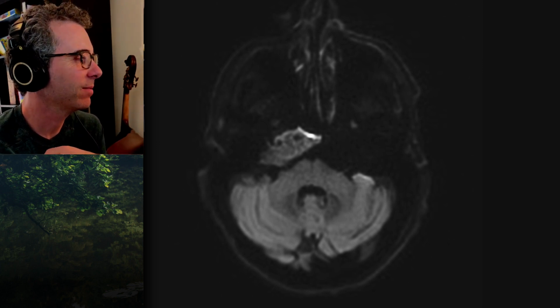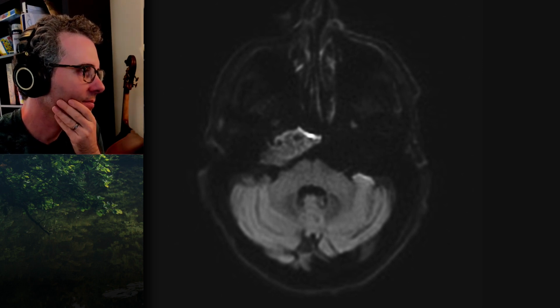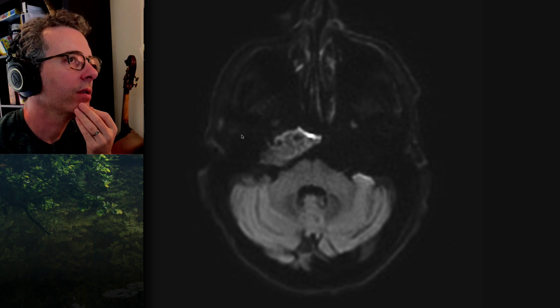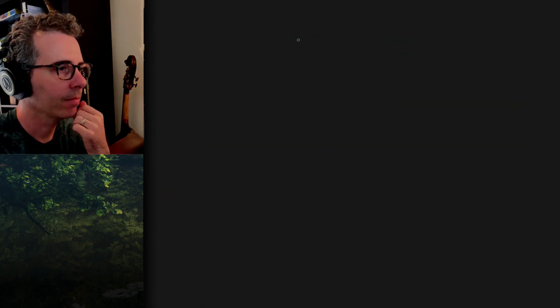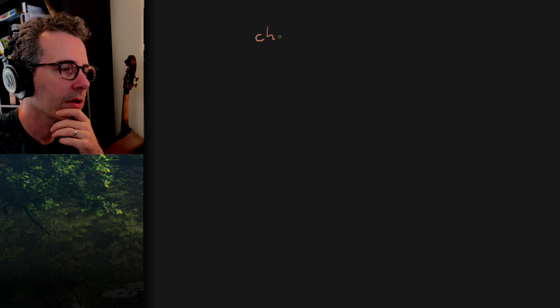All right, good. So what do you think? Well, I was starting to think a chondrosarcoma. Okay, so what's your differential first? Just morphologically, in petrous apex lesions, I was thinking a cholesterol granuloma, a paraganglioma, a cholesteatoma. Maybe a meningioma.